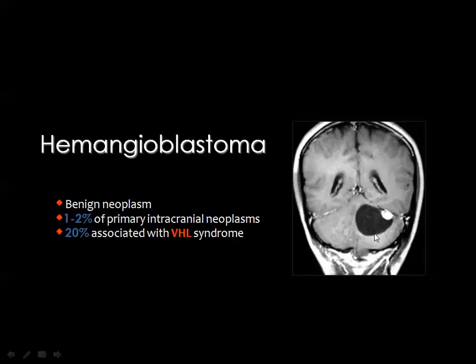Number two, in the hemangioblastoma, the nodule is hypervascular, and if you have an angiogram, you should see a tumor blush corresponding to the mural nodule of the lesion. But the mural nodule in the pilocytic astrocytoma is hypovascular and does not show any tumor blush in the angiogram. Also, the hemangioblastoma has an intimate relation to the von Hippel-Lindau syndrome, but the pilocytic astrocytoma does not have this relation. Also, hemangioblastoma can occur in multiplicity, but the pilocytic astrocytoma does not show this feature.